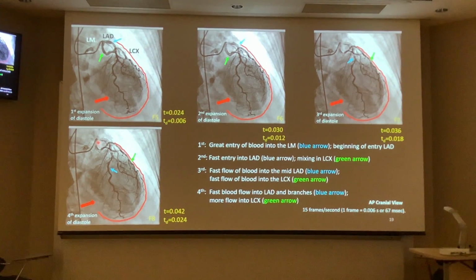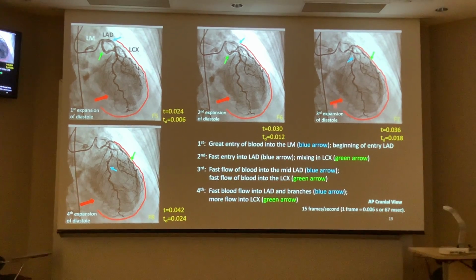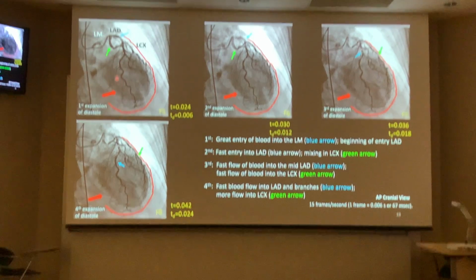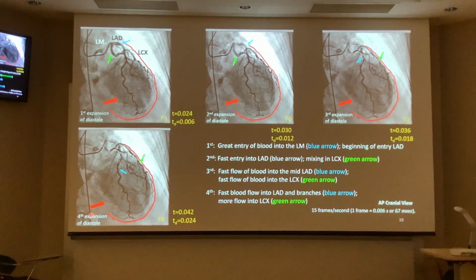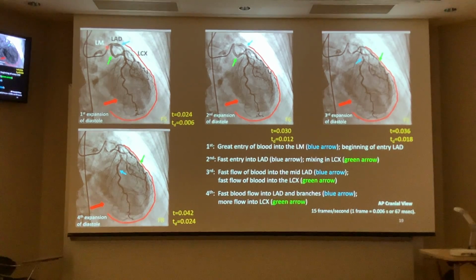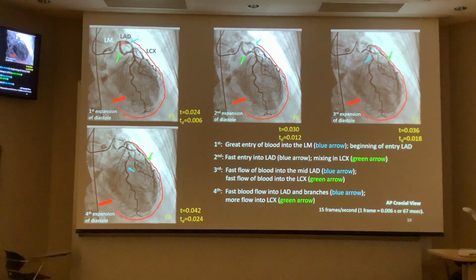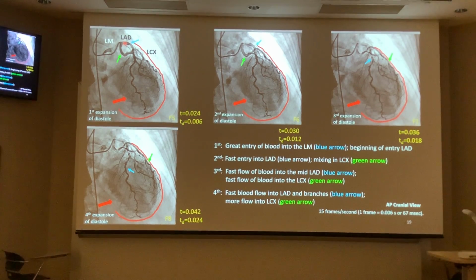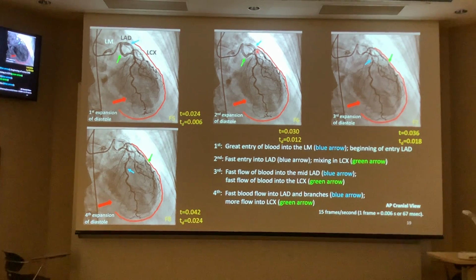If we look at diastole, that situation changes. Looking at the same time frame, 4 frames of the angiogram, as the heart muscle relaxes, you can see the big red arrow coming back out to the border. Suddenly, there's a big rush of white, or blood, replacing contrast in black through the left main and even in the proximal LAD.